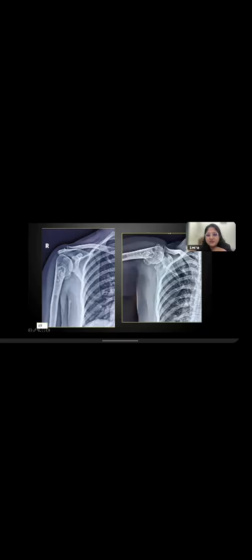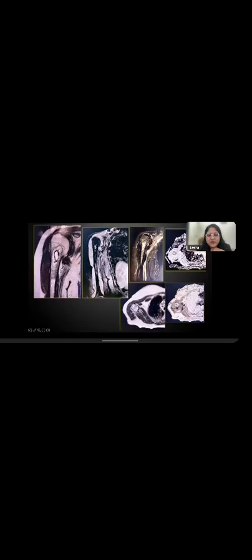The one lesion was here, and another lesion was on the posterior aspect. So osteochondromas of the humerus, which were completely benign, with no destruction or soft tissue component. However, the patient was radiographed, and that's how it came to light. An MR was also done, but it still showed a very well defined lesion, and there was no malignancy involved.